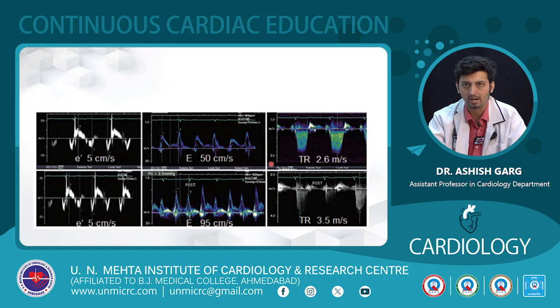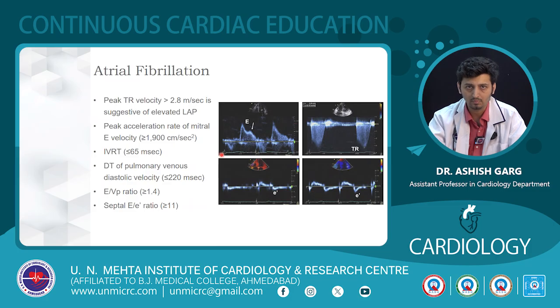So this was a patient, and we can see that the TR velocity has increased to approximately 3.5, and the E prime velocities, so mainly the TR velocity has increased here in this case. In atrial fibrillation, a peak TR velocity more than 2.8 meters per second is suggestive of elevated left atrial pressure, an IVRT of less than 65 milliseconds, and a deceleration time of pulmonary venous diastolic velocity suggestive of abnormal diastolic function.